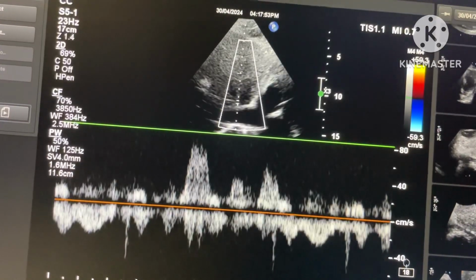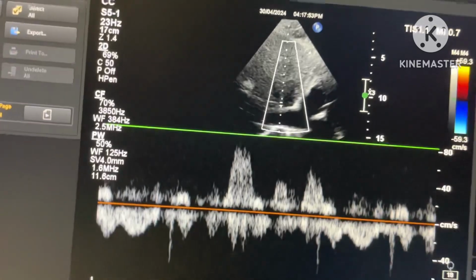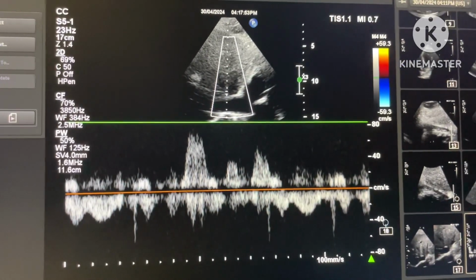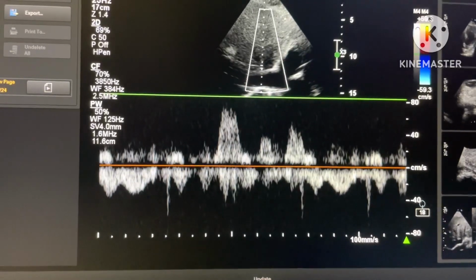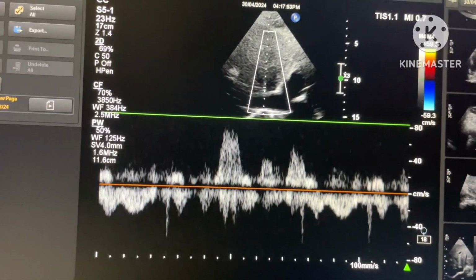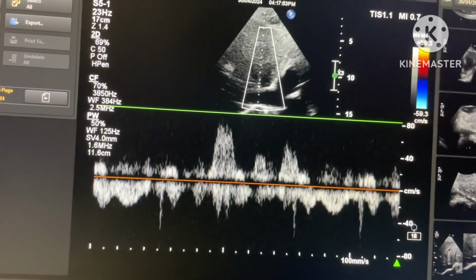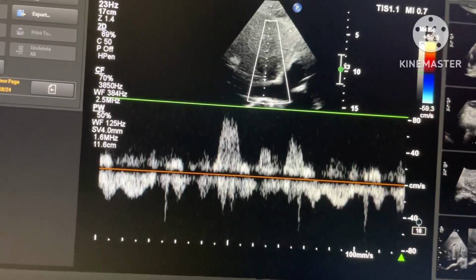The fourth thing that you can know from this image, though this is not a video, the video is not moving, is the diastolic flow reversal in the mid-hepatic vein, which has more expiratory diastolic flow reversal.